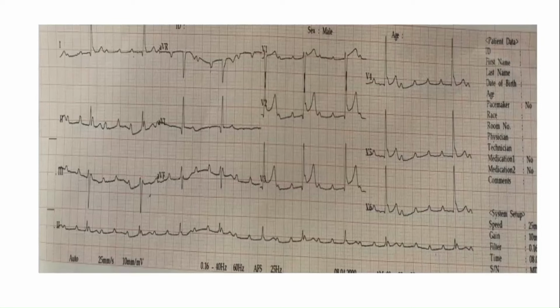Yes, this patient was around 40 years old and there was no evidence of AV block in the sinus ECG. So don't write complete AV block, please. Sometimes you get confused, but look at the atrial rate. Even the sinus rate with the AV block will not be so fast. You see, it's very fast P waves. Look at the cycle length of that.